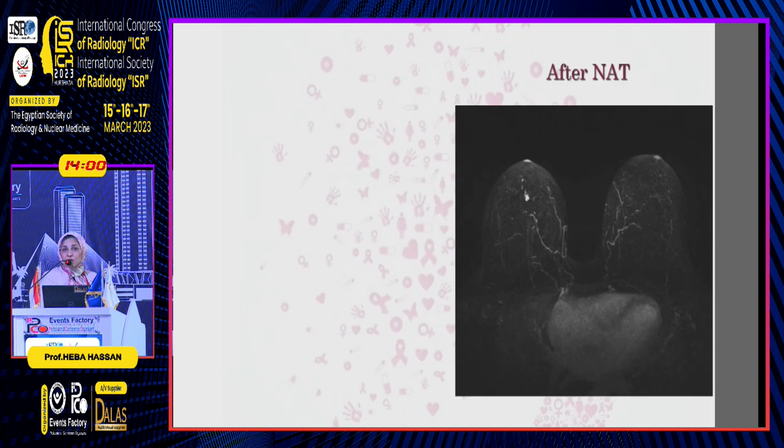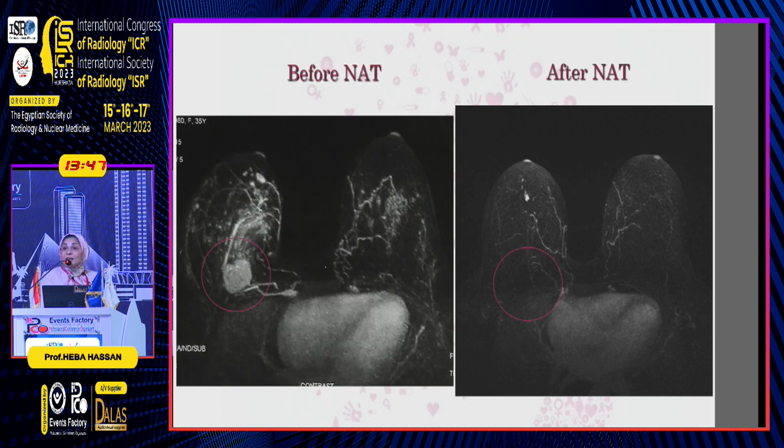We have an MRI of the breast after therapy. Can you identify any lesions? Well, we might have a very small focus, but is this the main lesion? Well, we have to do a baseline MRI before the start of the treatment, not even after the first or the second cycle. Even then, the tumor itself would have changed.